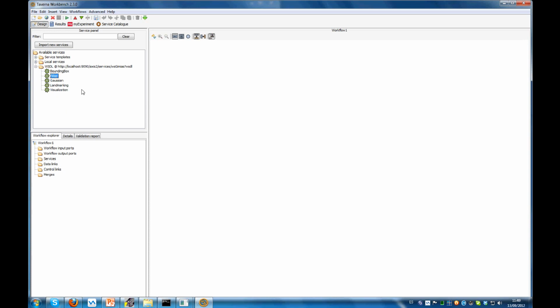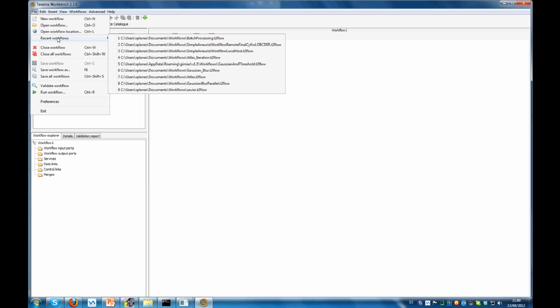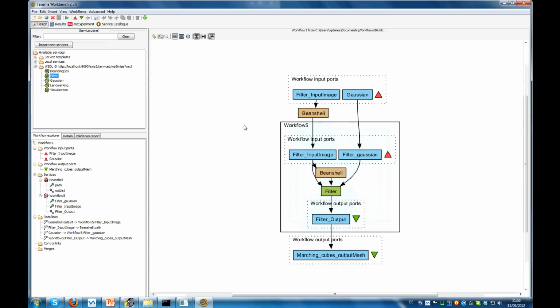So what we'll do now is to create a workflow using the filter application. I already did it before, so I don't want to spend too much time configuring this workflow, so I will just load it. So this is the workflow. You can see here at the top these are the inputs. Here is the input folder, which contains all the input images.